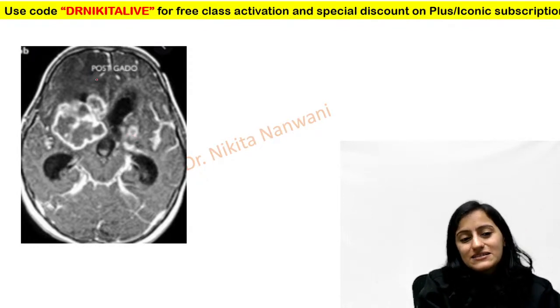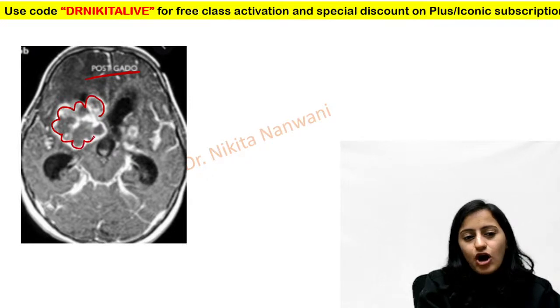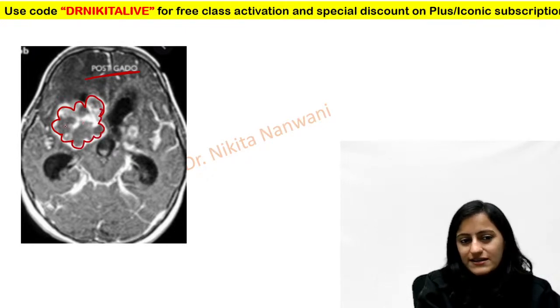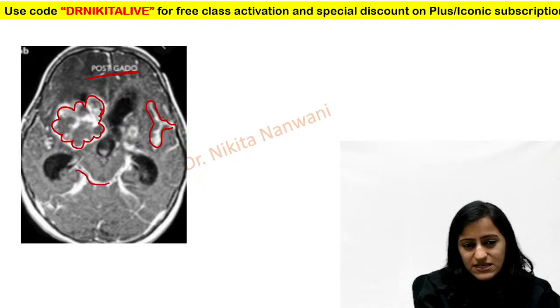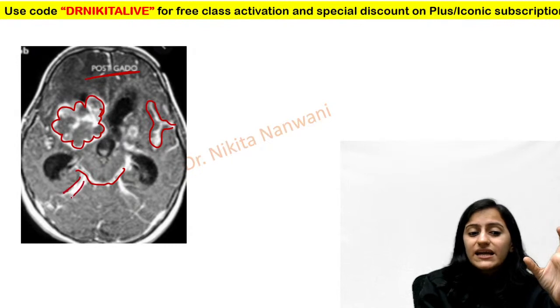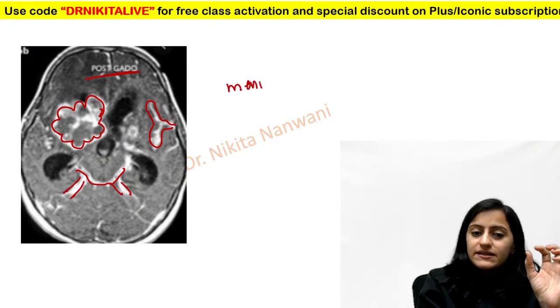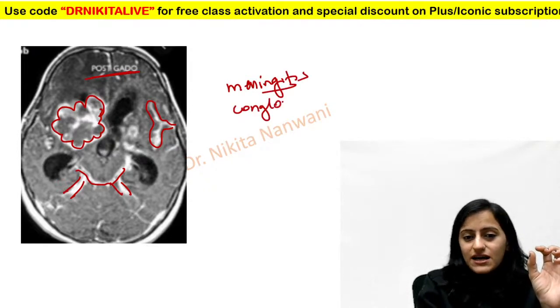What do we see here? This is post-gadolinium. It's a contrast MRI. This lesion which you see here, it's a necrotic lesion. Only peripheral enhancement is seen. Central is non-enhancing. It's a conglomerate lesion. And all this which you see in the sulcal spaces, this is like the dirty enhancement that we are seeing, the thick enhancement along the meninges. Meningeal enhancement, that is meningitis. And this is a conglomerate lesion that we are seeing.